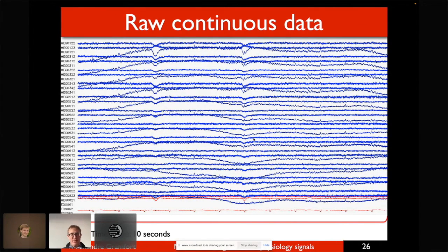So we have someone saying high frequency noise and baseline drift. Exactly. So we have high frequency noise. You see that the signals have these wiggles that suggest that you have some buzz on the signal. You have these slow drifts that you mostly see on the magnetometers, like these very slow fluctuations. But also, if you zoom a bit, here you see these types of peaks in the signals, and you see they are perfectly aligned with the EKG, and these are just corruption from the heartbeat, specifically in the magnetometers.